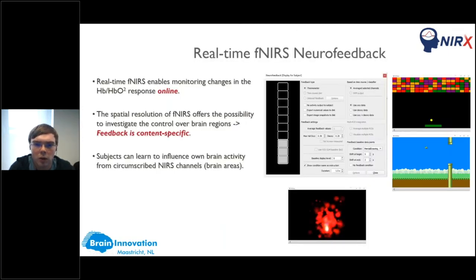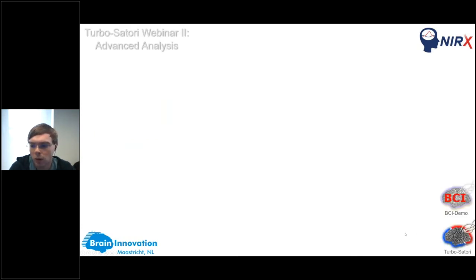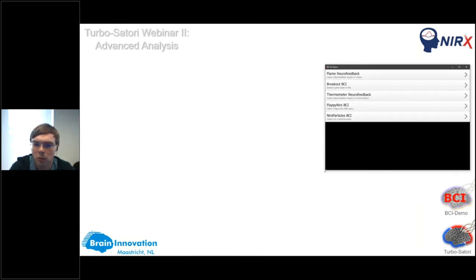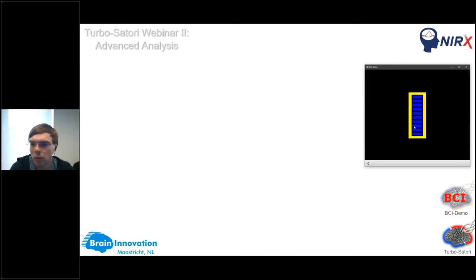I was shortly talking about neurofeedback applications, as you saw in the first webinar. The main idea is that you present to the participant or patient the information of their brain activity. This can be done using, for example, a thermometer, or, as I will show you later, different BCI examples. Now, how does this work? First of all, I can start the BCI demo, which is just a little application which can, for example, show you the thermometer feedback. And I want to connect this now to Turbo-Satori.